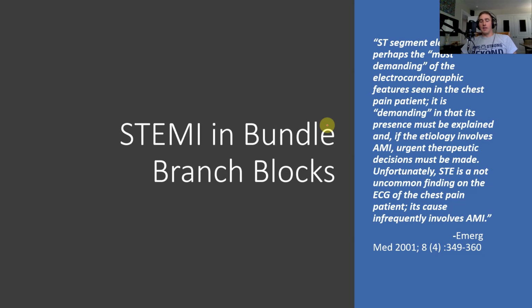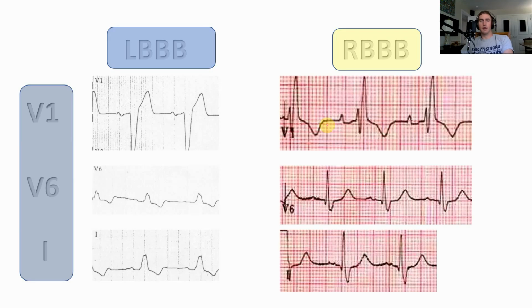So, knowing that you can diagnose a STEMI in the setting of a left bundle branch block or a right bundle branch block, you now know that the onus is on us to know how to interpret those EKGs, and we are expected to make those decisions in the field. It's no longer, if it's a left bundle, we can't make the call, we've got to wait till we get to the ER. That is false. We are responsible for knowing how to interpret EKGs.